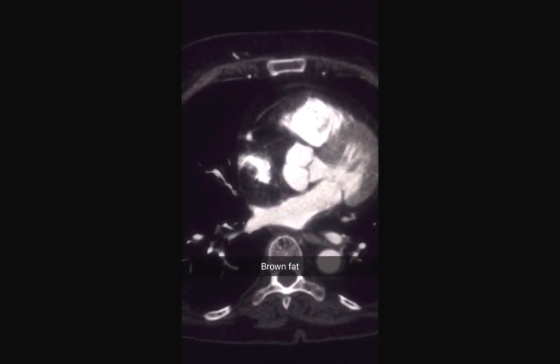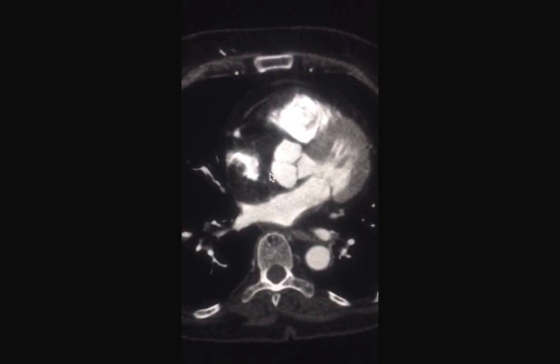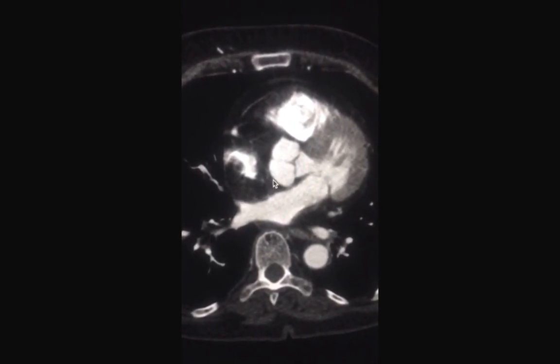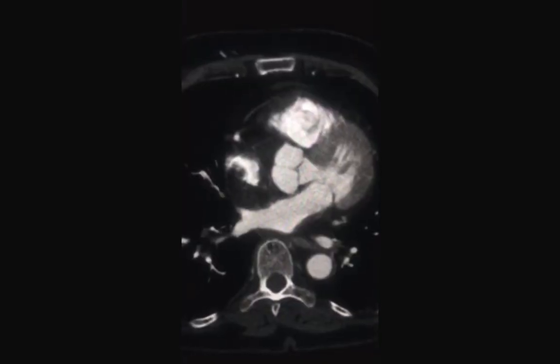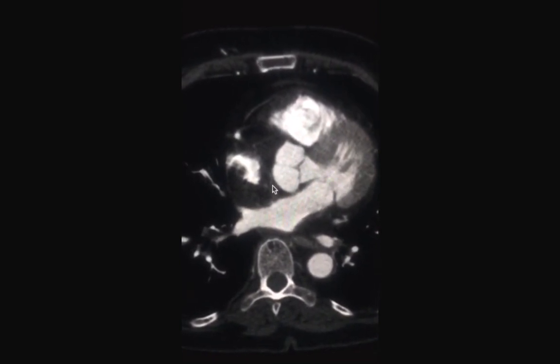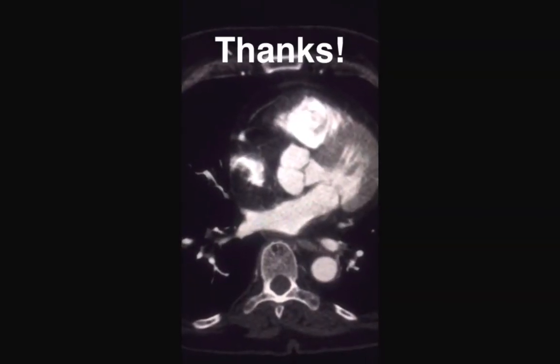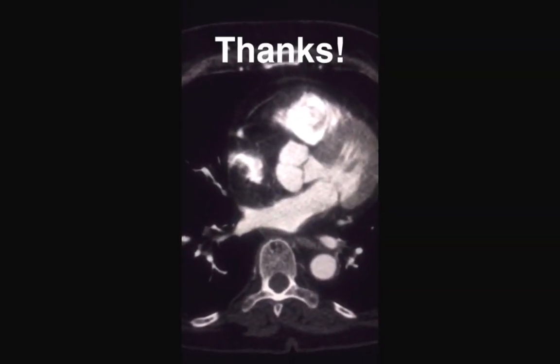To conclude, lipomatous hypertrophy of the interatrial septum is replacement of the interatrial septum by fat, which could extend into the crista terminalis. This appearance may be very confusing on echocardiography and may be mistaken for a mass, and even sometimes more confusing on PET scanning if it's brown fat. Good news though, it's an easy diagnosis on CT scan by noticing the fat density and the classic location.